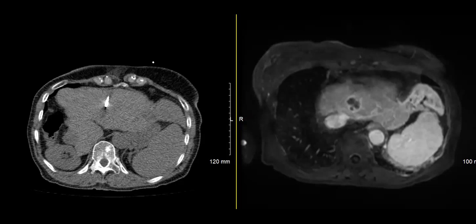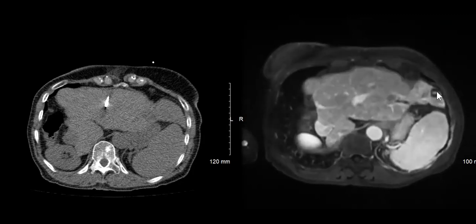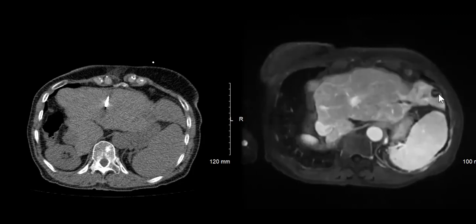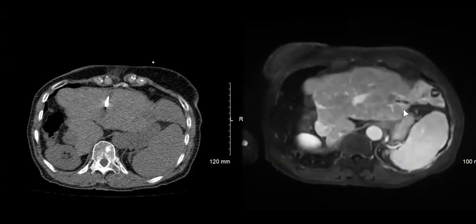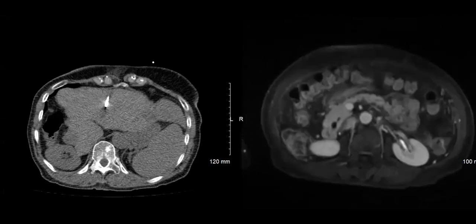And I'm actually amazed that she's not developed more things, given what looks like advanced cirrhosis and 10 years of surviving from her cholangio. Don't get me wrong, since then, again, I don't remember the gender, there were other lesions. This was treated. These were all cavities, stable.